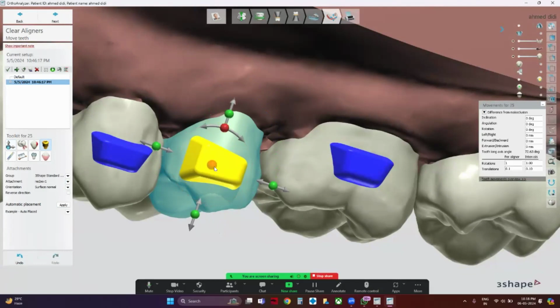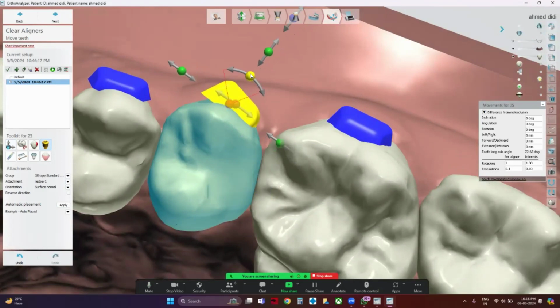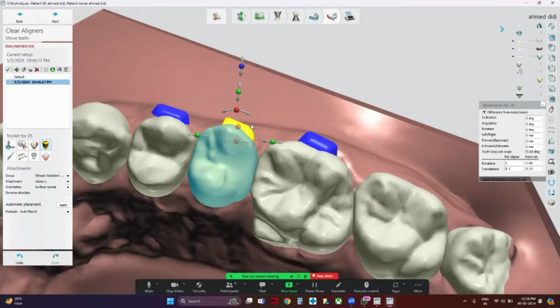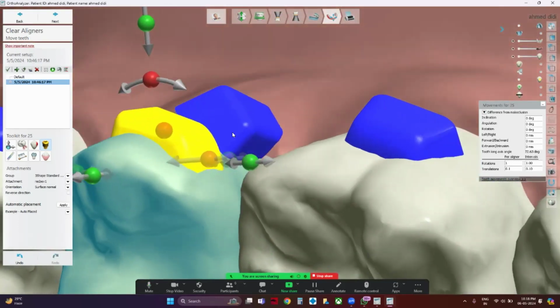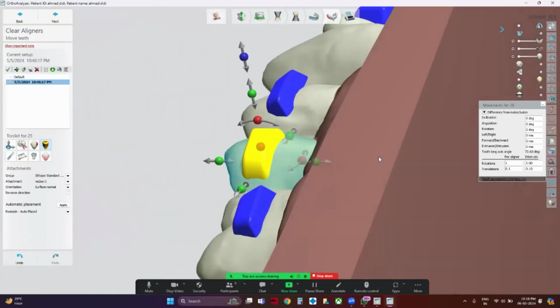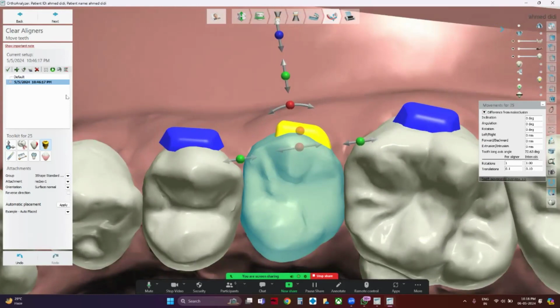For example, like this or like this. Then you try and use the green bar to increase its length, and then you shove it inside. And then increase the surface area or make it flat like this. Can you appreciate how intimately in contact it is with the tooth? Yeah. So please be careful with this, because these attachments won't last.